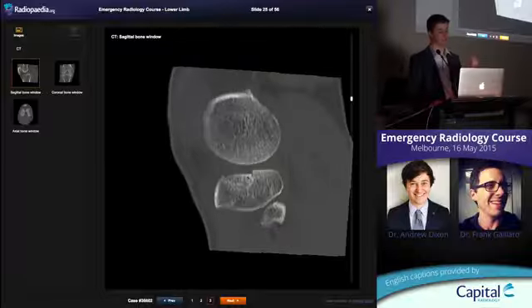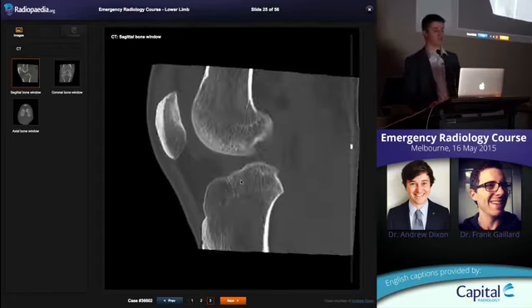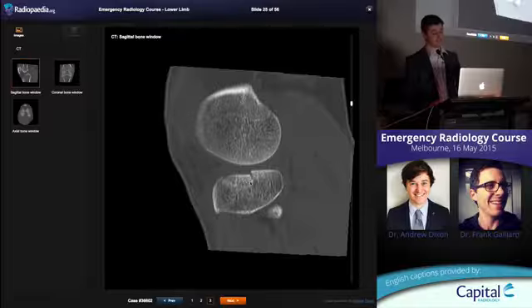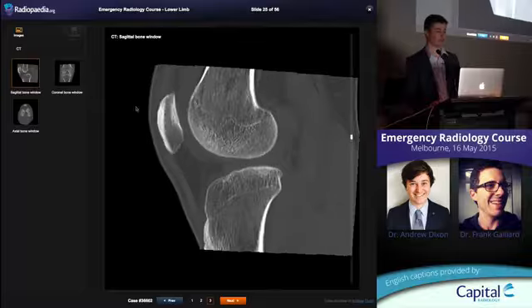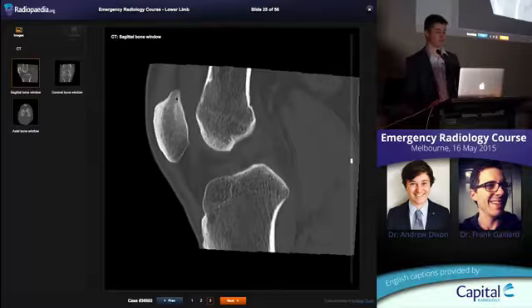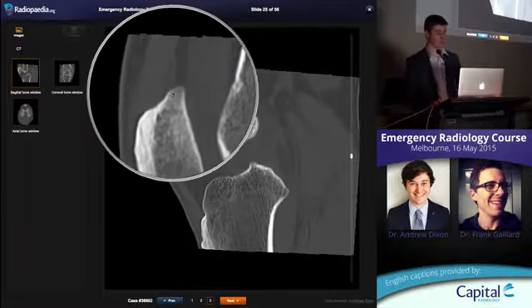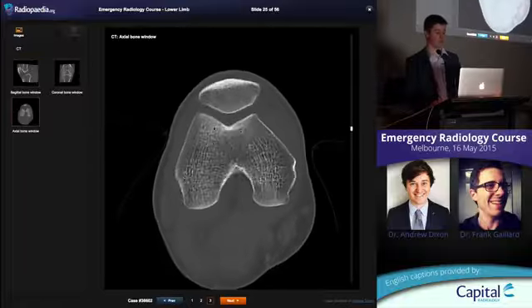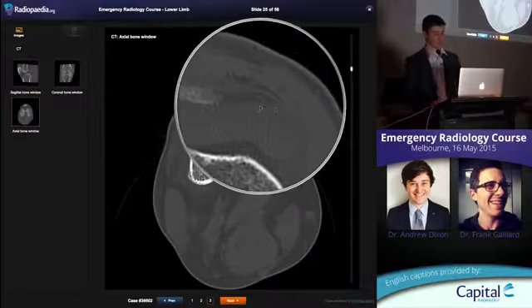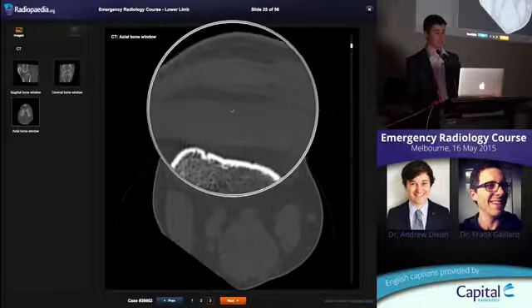It's very common for these lateral tibial plateau fractures to be occult on your X-ray. This could develop into an unstable fragment if the patient isn't managed appropriately. Okay, and then correlation with that lipohemarthrosis, the quadriceps fat pad here, that little bit, that's the lipohemarthrosis forming a perfectly straight line. On the axial images, again here, perfectly straight line, fat in front, blood sitting behind it.